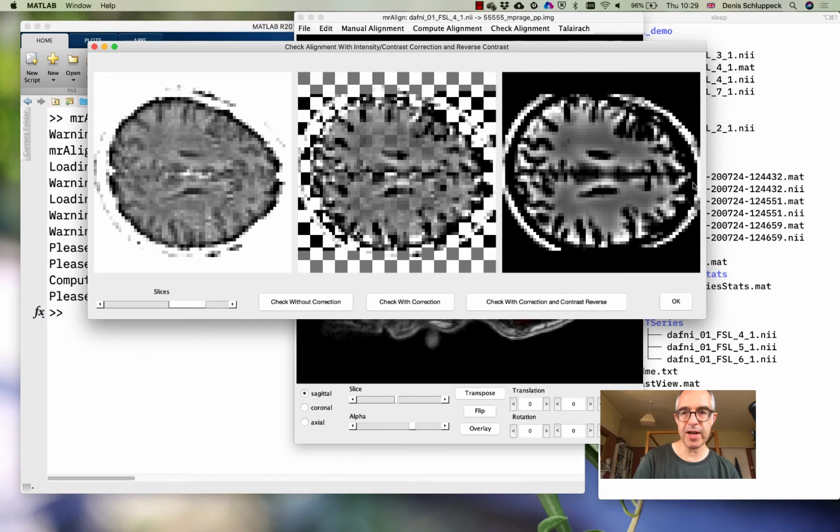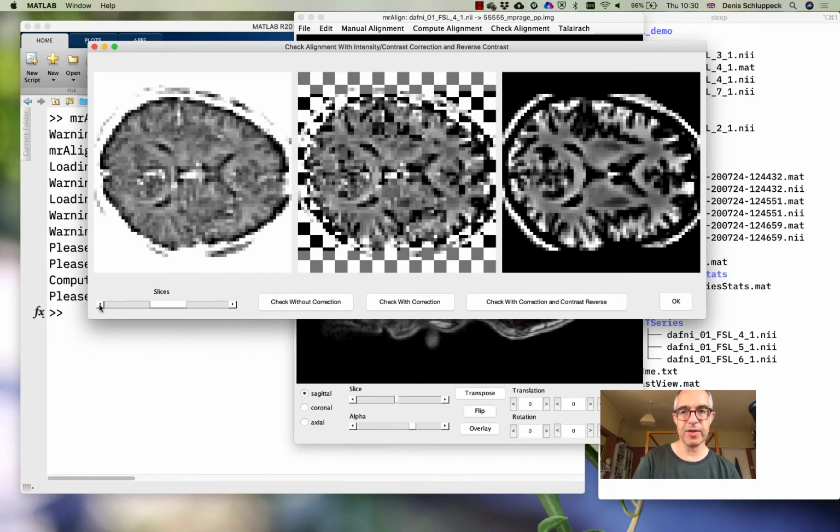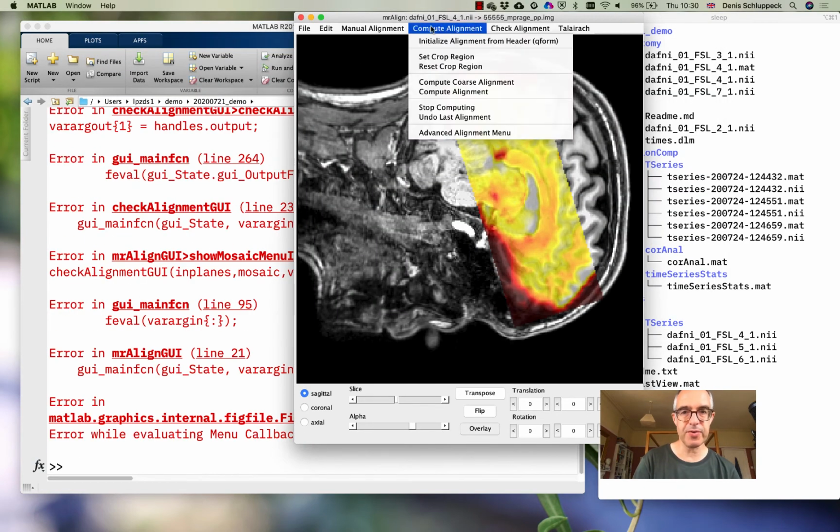Now, one thing to look out for in alignment in general is to make sure that the gross landmarks in the gyri and sulci match up, because it's quite common that there's a left-right flip in the data, and you want to avoid being stung by that. So I quite often look at the shape of the ventricles, the major gyri. It looks like, in this particular section, this fissure looks quite big here, and it's visible there as well, so hopefully that works.